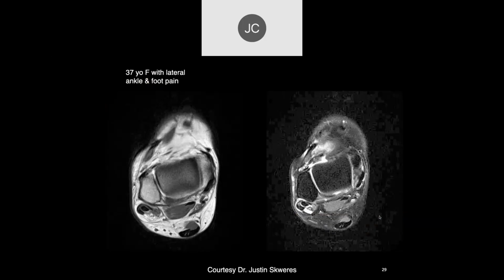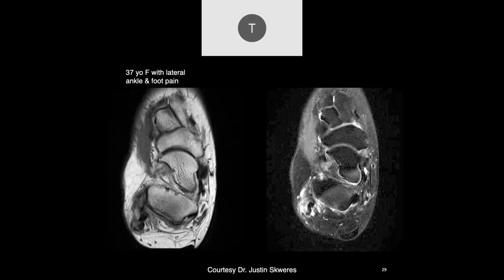Okay, Tayson. All right. Looks like you have kind of a C-shaped appearance to this peroneus brevis. I'm not sure if it's split or not, but definitely at least a high-grade longitudinal. Here's farther down. All right, so now I think it is split. There, and then the longus is here.